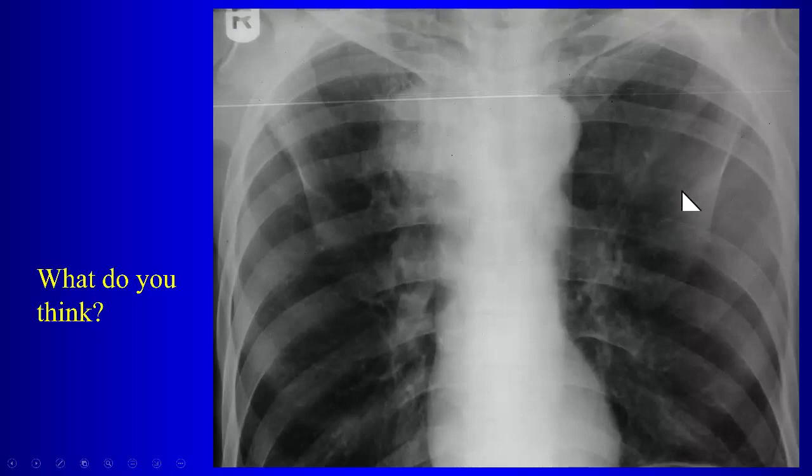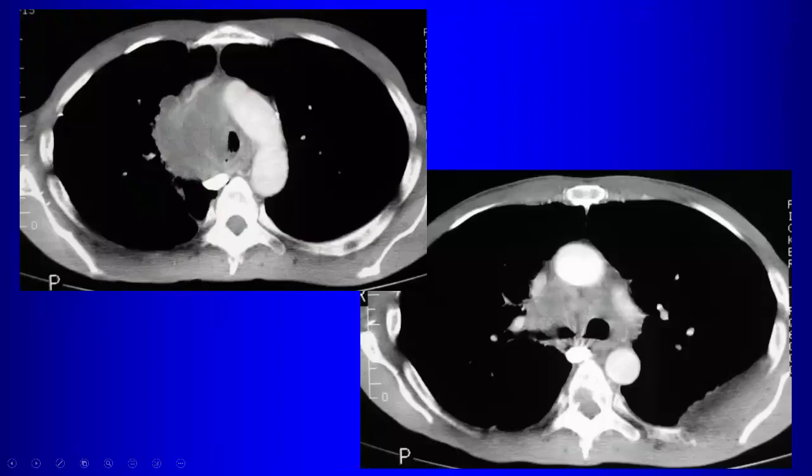Metastatic disease, right? So again, when we see something that might look like cancer, it's important to start going through your checklist of other things to look for: pleural effusions, other nodules, mediastinal nodes, bones. Look very carefully at the bones. So there's rib disruption here. Here we see our big central tumor, or lymphadenopathy. Here we see the mass with the rib destruction.